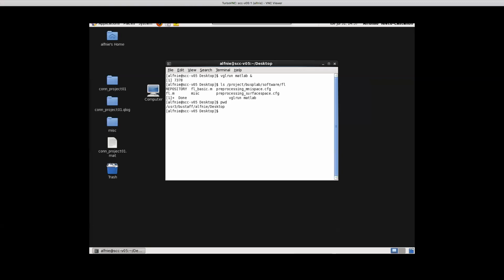Since you are representing the surfaces in terms of these individual nodes, you would like to have those nodes in the same location. So what you do, you have this very dense set of nodes that form triangles in the sphere, and you resample them into a different set of nodes that look as uniform as possible within the same sphere. You can then take that tessellation that looks very uniform in the spherical representation and put it back using the transformation that got you from the subject data to the sphere, just de-inflate it, so to speak, to get that tessellation back into subject space. And that will be the difference between that subject space and the original subject space representation of the surface. It will just be a matter of the resampling of the same surfaces in terms of individual nodes.